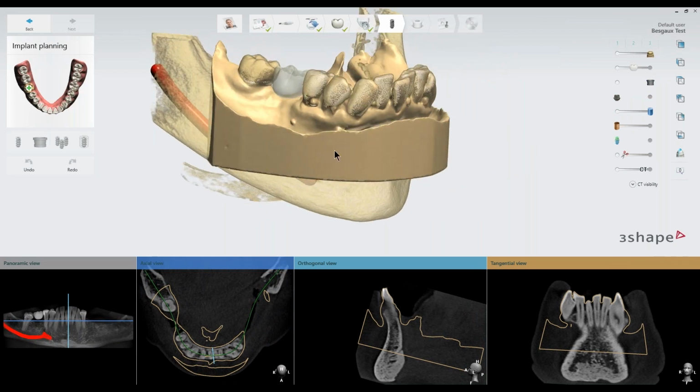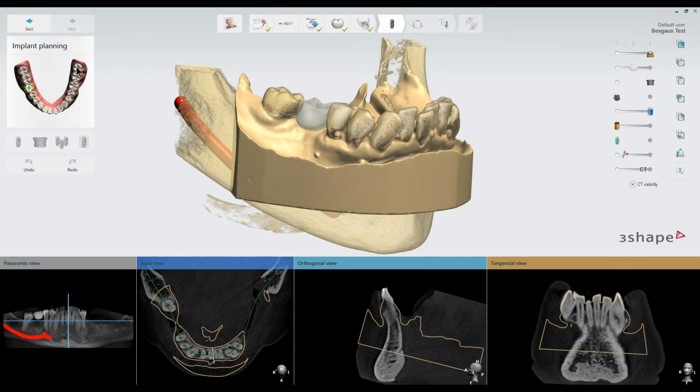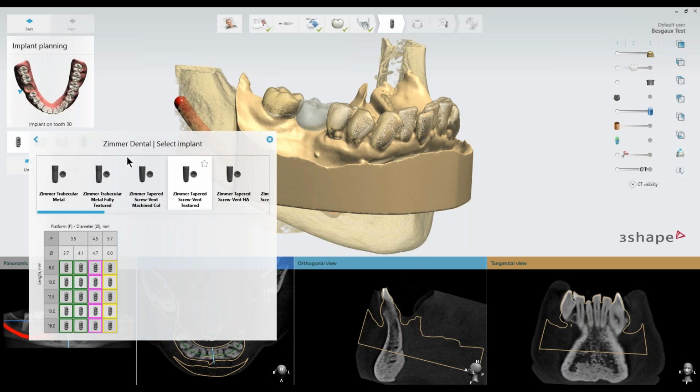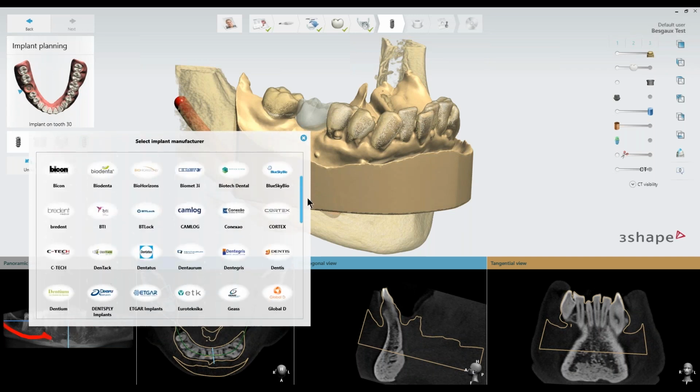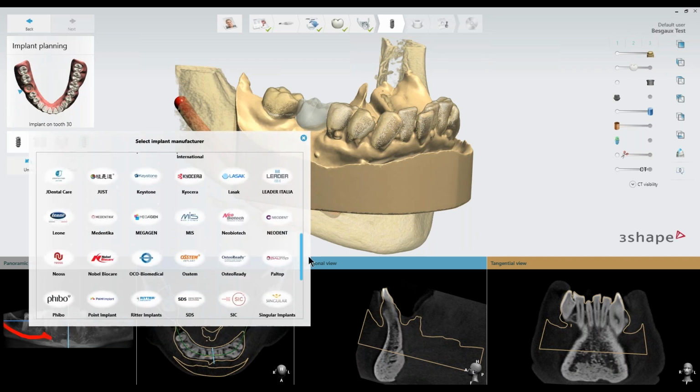At this point, the first thing I have to do is go to this tooth chart in the top left and click the little plus sign on any units I added during the order form creation. It'll pop up with whatever is the last implant that you had worked with, but if you hit this arrow, you can go and browse through the full list of implants that you've downloaded.